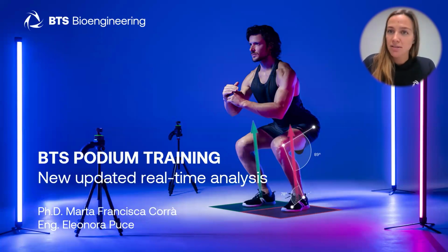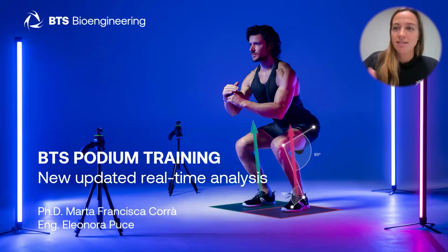I'm going to start explaining how the Podium is constituted, and also my colleague, engineer Eleonora Puce, will help me and start the second part of this training.